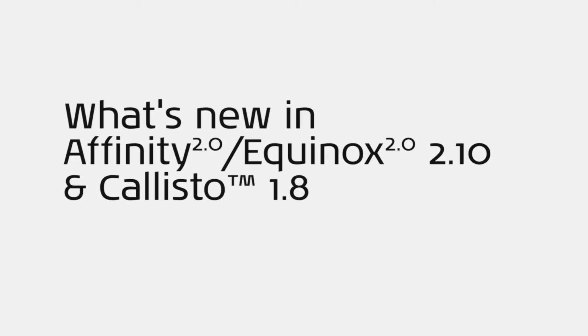This video introduces the top 5 features included in the latest release of the Affinity, Equinox and Callisto suite.